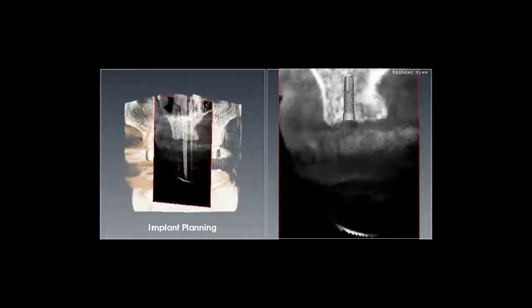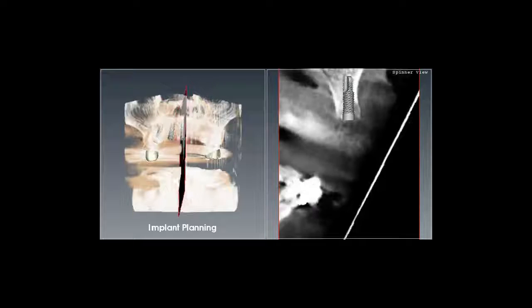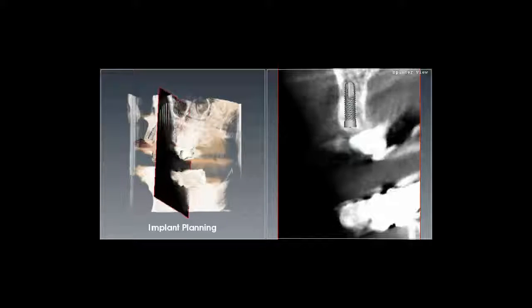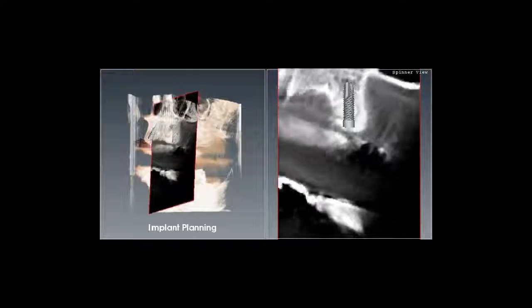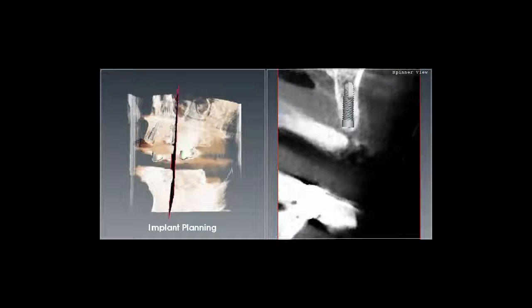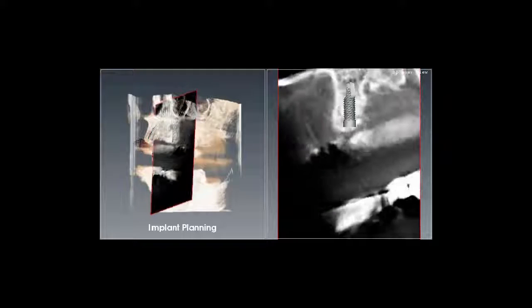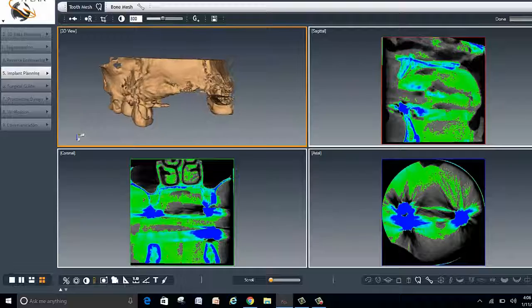So 2 implants will be placed on 8 and 9. That's where the bone is, and this is showing tooth number 8 right now, the animation, and that's where the maximum bone is. And then we're going to place one on tooth number 13, 14 area there to get the maximum AP spread, so that if need be and the patient decides to extract these molars, we can do a cantilever there with enough implants in the front to support the AP spread that we need.